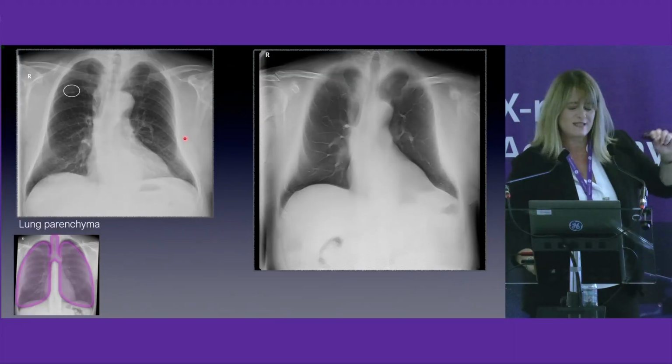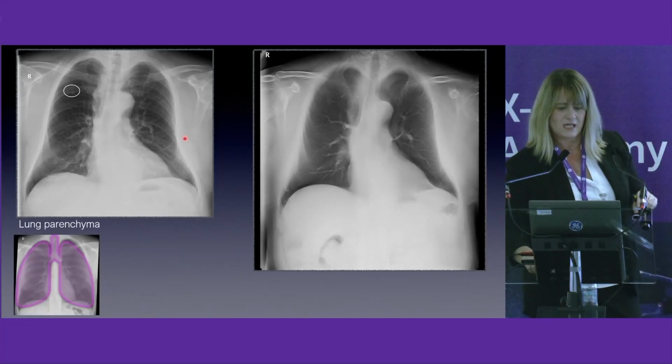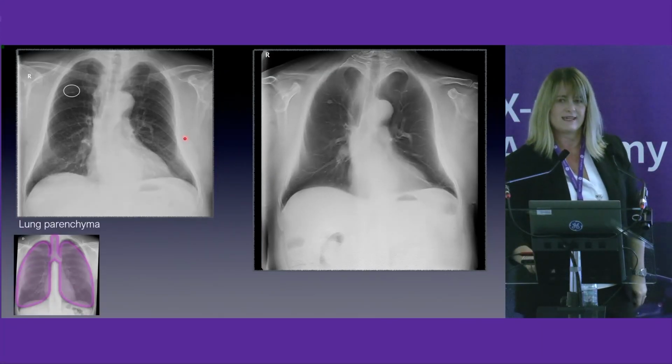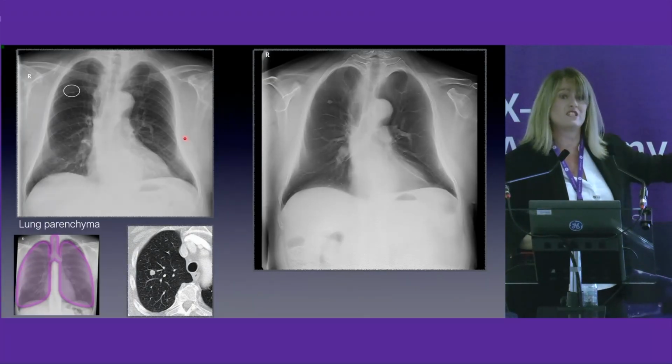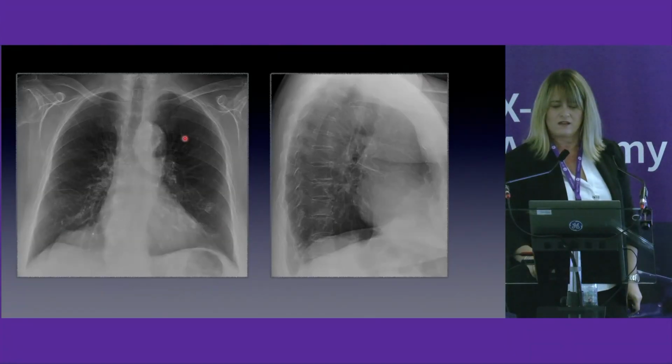Let me show you just some planes, not the entire volume, but I selected some planes, moving from the anterior to the posterior part of the chest. That's a nodule. Then we performed a chest CT scan for staging. So it's quite useful in distinguishing lung nodules.